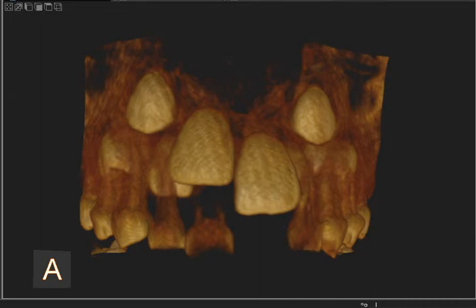I'm showing you here a CBCT that we took on our patient that was recently described in an issue of Orthodontics Products magazine. The panoramic x-ray revealed overlapping unerupted permanent teeth, but it was difficult to see what is happening and how to manage the eruption of teeth, and it limits our ability to diagnose root resorption and supernumerary teeth. The machine that we're using is a limited field CBCT by Kodak, a Kodak 9000.